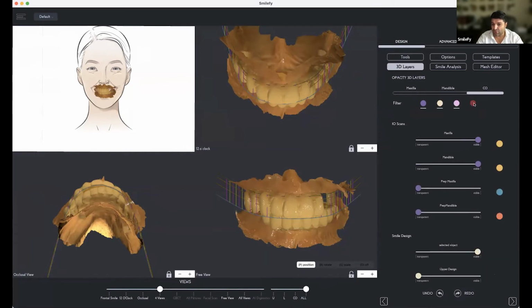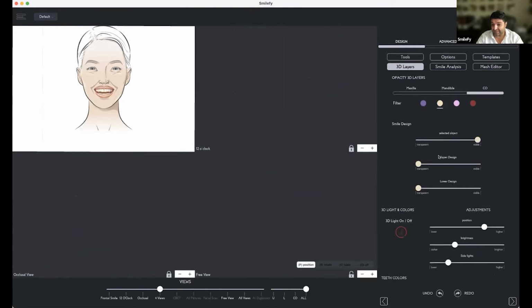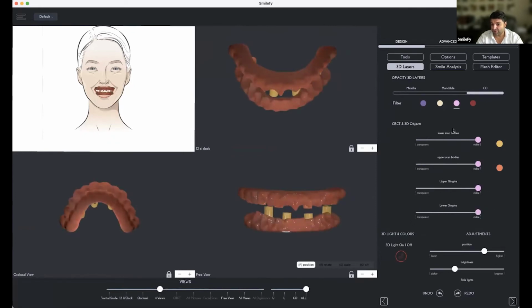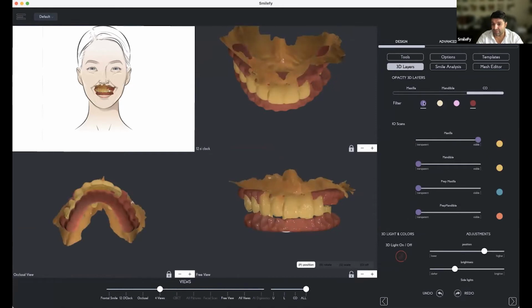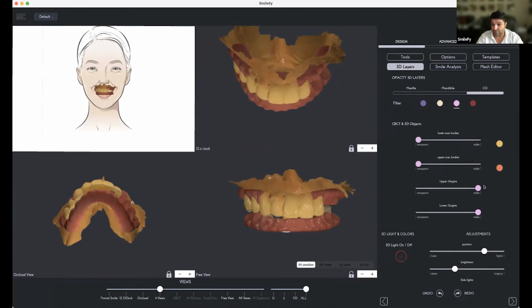And the filters show you, number one, the intraoral scans. So purple is intraoral scan. White is design. Pink, or whatever this color is, is scan bodies and gingiva, so generated objects. And red actually is generated objects. So now, if you want to see only the intraoral scans, for example, you can have the sliders for the intraoral scans like this. Let me reduce the opacity so that we can see everything one by one.